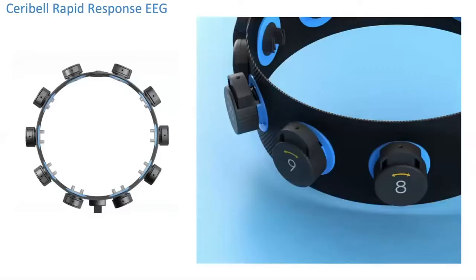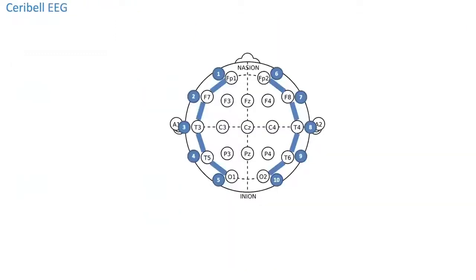With the headband going around the head in a circumferential montage, it collects electrical activity across the transverse of the brain with 10 electrodes. So the reading of the EEG is going to be different than the conventional EEG reading, since this is going to include only 8 channels.